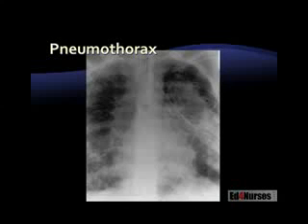Now, again, a lot of these slides, it's kind of hard to get an x-ray to come out good when you're looking at it here on a screen on a video. But lungs are expanded. Okay, we have a nice diaphragmatic arch, nice costophrenic angles. Where'd the heart go? Okay, this is a PA view. It's looking from the back toward the front. That's why you're not seeing the heart as well. All right, now, what we're looking for here is a pneumothorax. A pneumothorax is going to look like the lung is not fully expanded. Now, notice over on the left-hand side of your screen, the lung comes all the way out to the chest wall. But on the right-hand side, you notice how there's some arrows here.